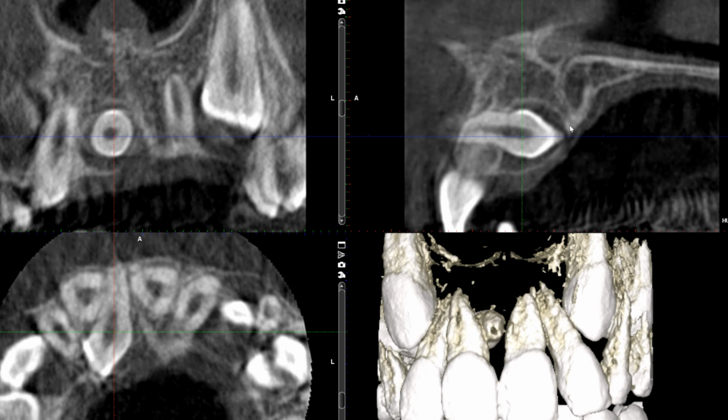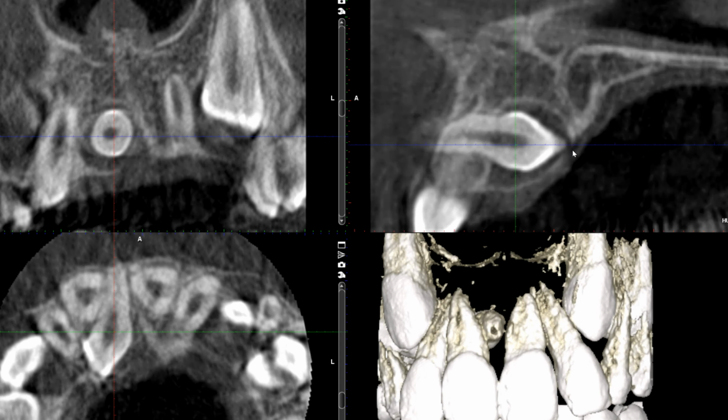So see how thick it is, and suddenly it becomes very thin at this area toward the tip of the Mesioden, right? So it's very thin. It's possible that maybe it's focally fenestrated. So those are some considerations. It occupies the full buccal lingual thickness of the alveolar process, right up against the buccal cortex. So yeah, it's actually horizontally positioned rather than inverted. So that's another thing that we were kind of thrown off by based on the view from periapical radiograph.